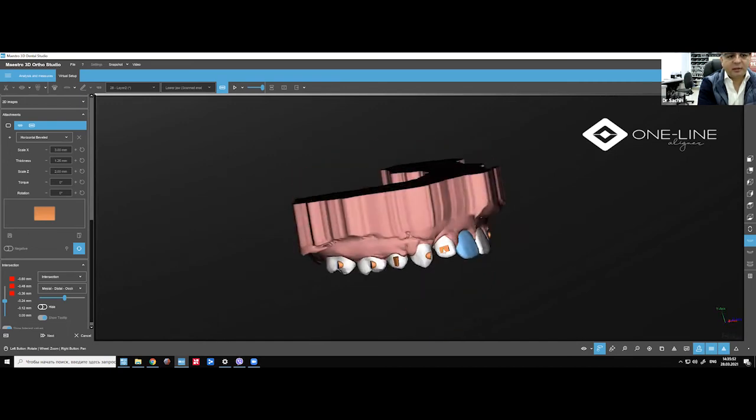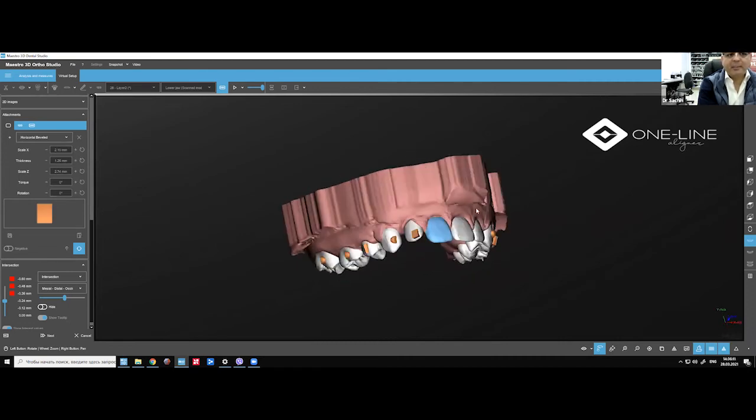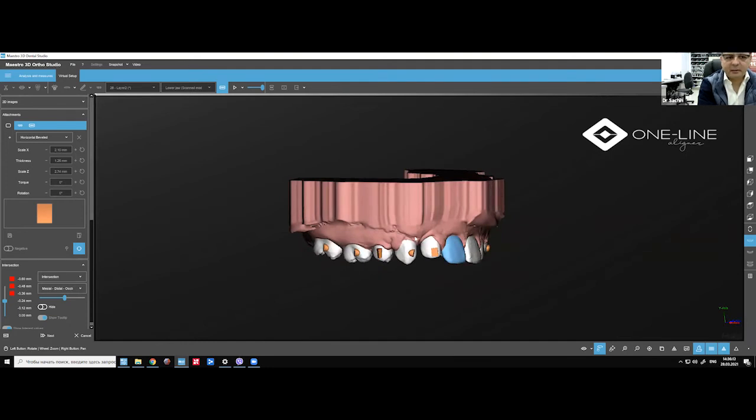So you need to think about rotation as well. So you need to go more mesial. You need to go bigger, near the corner of the tooth. And you can make it a little shorter, a little thinner for extrusion. And what will help is that in the future, if you need buttons, you have enough space for buttons, you know? I think I made this clear.